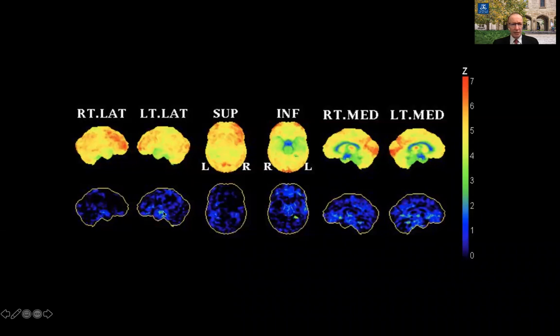So here on this left lateral view, there is very mild reduction in metabolism. On the inferior view, you can see a bit there. But there's some scattered bits all over the place, so you don't want to go overcalling things too much. It is also hinting that the medial temporal lobes might be a little bit down. Let's go back and have another look.